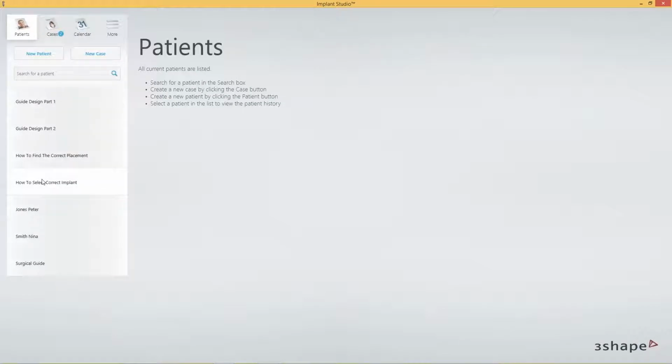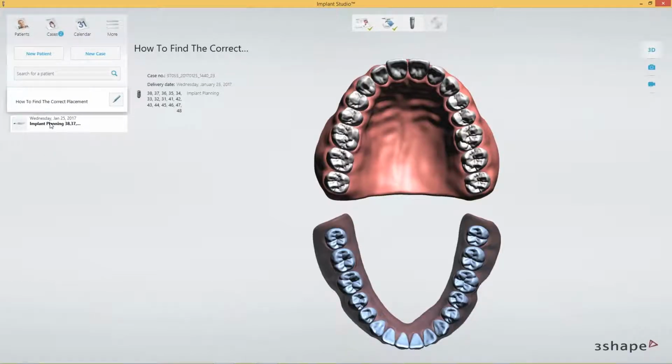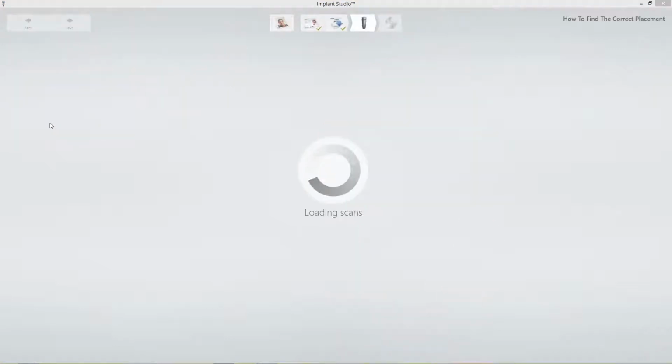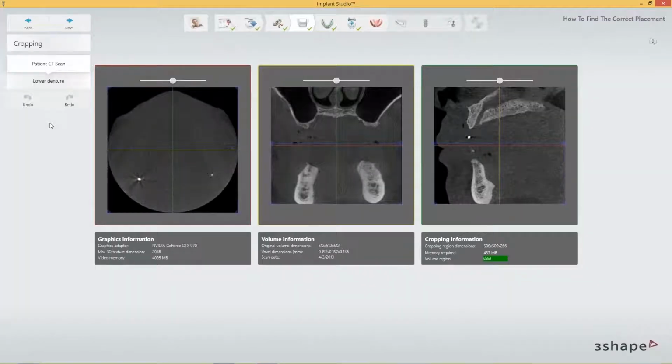We have a quick question while we change case. Yeah. So another question was, when we do the spinning around the implant in the cross section, how do we operate that? What did you press? You're using the mouse wheel. I'm using the mouse wheel, that I can tell you. Also, there are two more keys on the keyboard that we always use when using the software. It's control button and it is the shift button as well.